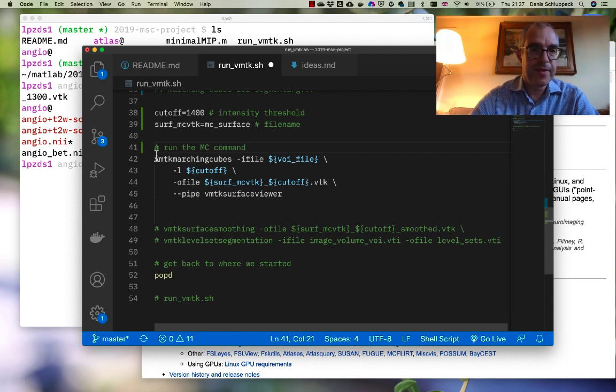They're basically written like little Unix commands. There's a whole collection of them if you install this program properly. There's an image viewer, which feels a little bit like the FSL viewing tools, and a bunch of little command line tools that you can stitch together to build up these pipelines. I'm not saying you should go away and learn this whole new tool. I'm just saying these are some of the things that are available to us and we can play around with.